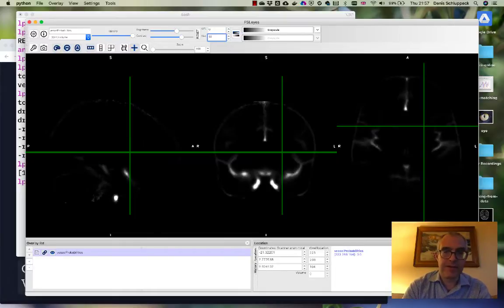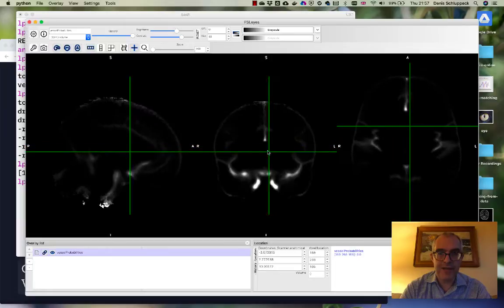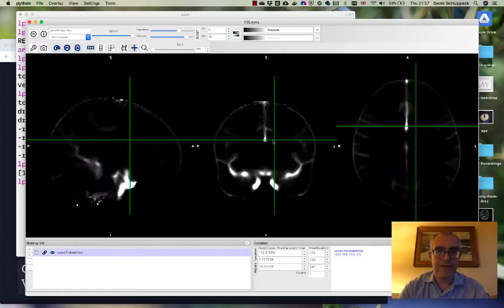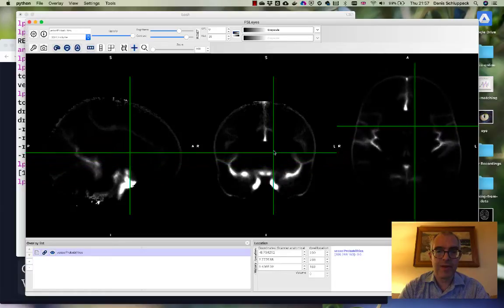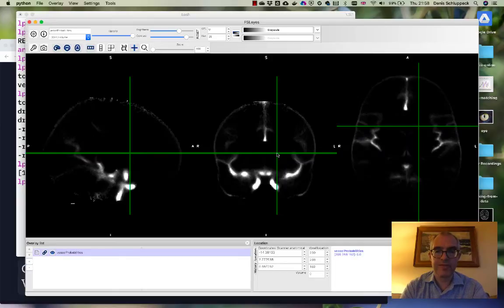All right, so I'm going to hit the button now, and you can see that the range of things that you can see has changed slightly. There seems to be more structure present. And maybe if I go to 25, then we can see even more. So what's going on here? Why can we see more of that structure? Has that got something to do with changing the probabilities, or is it just a display thing, do you reckon?